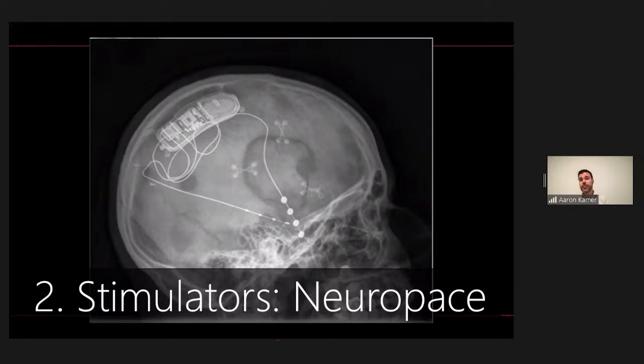So another type of stimulator that has been coming into vogue is an intracranially implanted device that stimulates deeper within the brain. This is an example of a NeuroPace. And in fact, Paul Martin, the resident who's working with me, and I just yesterday morning saw a patient who had recently had one of these implanted, who was recently in the hospital. You can see these leads actually go deep within the brain in order to stimulate the areas of the brain directly that are causing seizures.